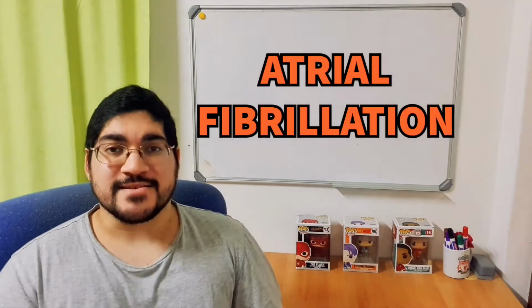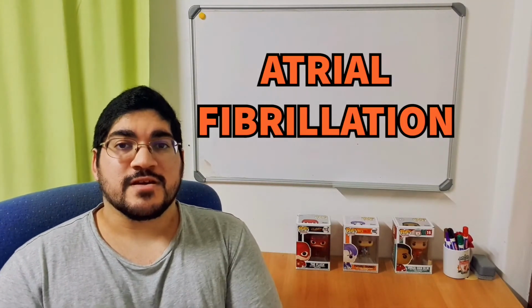Now we're going to talk about the irregular narrow complex tachycardias. And what does an irregular rhythm signify? It signifies that there are multiple pacemakers, because multiple pacemakers firing off asynchronously gives you an irregular rhythm. And the most famous irregular narrow complex tachycardia is atrial fibrillation, AFib. Because in AFib you won't even see a P wave. There's just multiple atrial pacemakers firing off one after the other. So you don't even see a P wave, you just see a mess. And you'll see a really high heart rate.